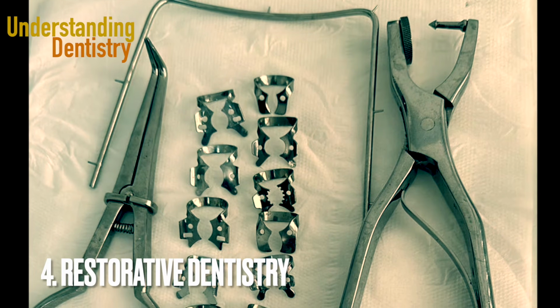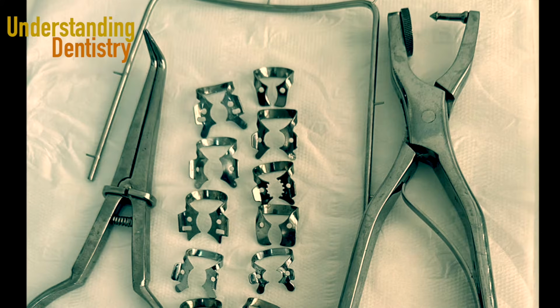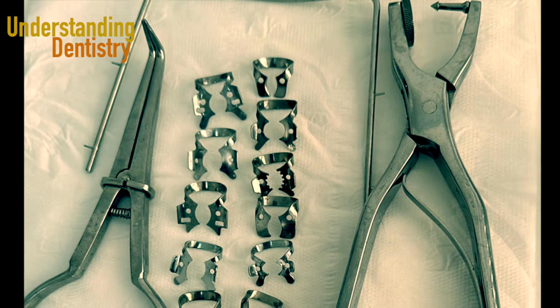So this is the rubber dam kit. Of course, the rubber dam is not here, it's just the blue, usually blue, right? The rubber dam.